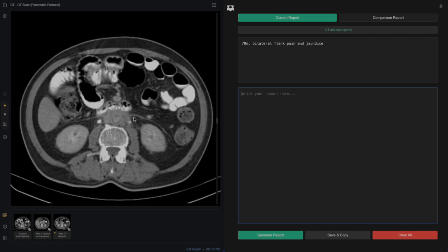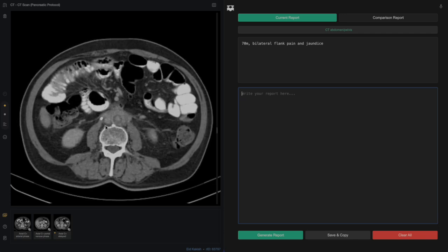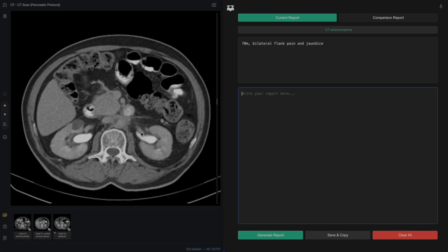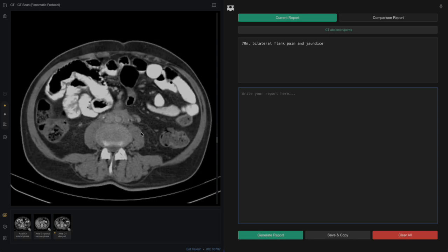The mass is quite irregular, as we spoke about. We can see it kind of plasters the aorta down onto the vertebral body sitting behind it. It doesn't really lift the aorta away from the vertebral body. And when we follow it up, it probably continues up to just below the level where the renal arteries come out. So it's that level and below.